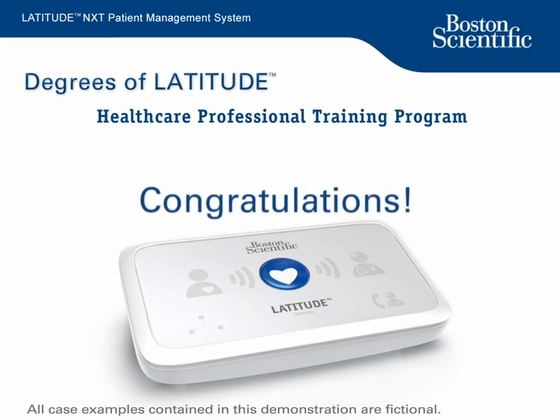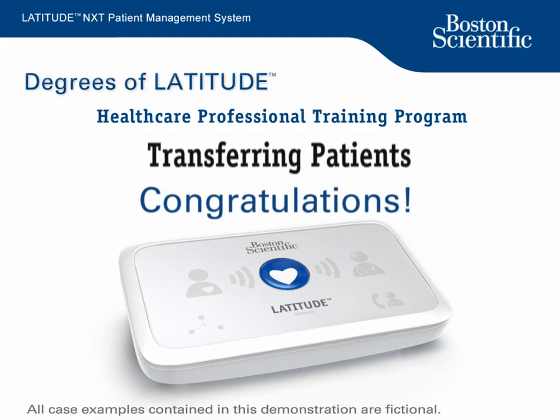Congratulations! You successfully completed the Degrees of Latitude module on transferring patients in LATITUDE NXT.